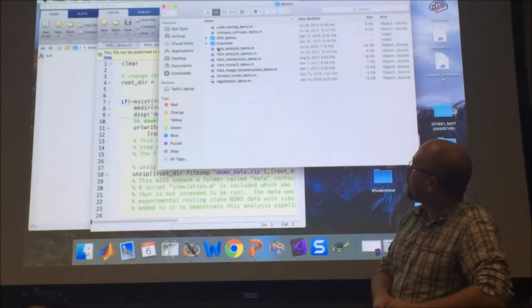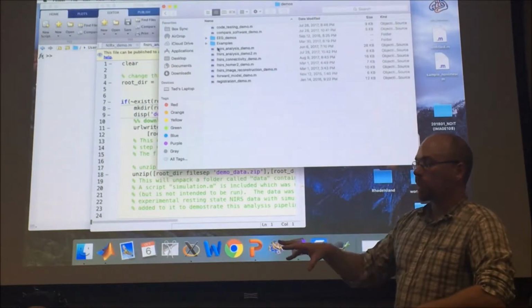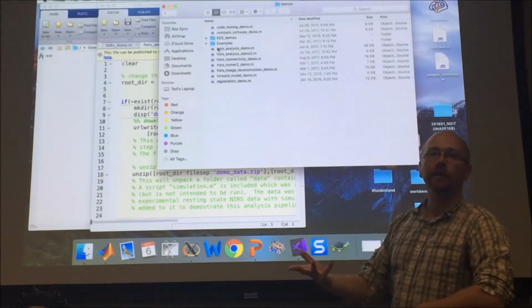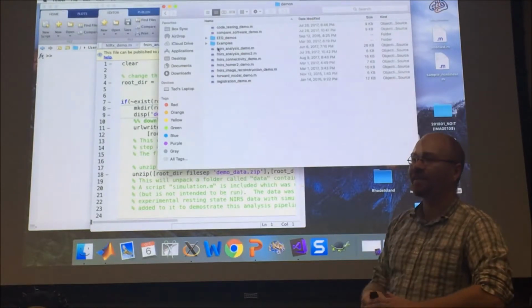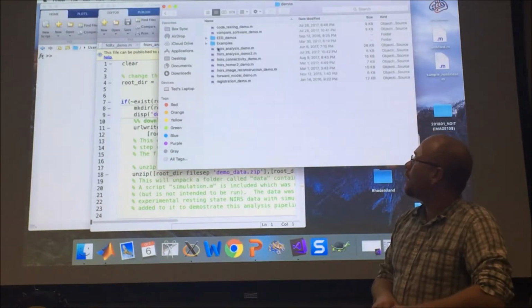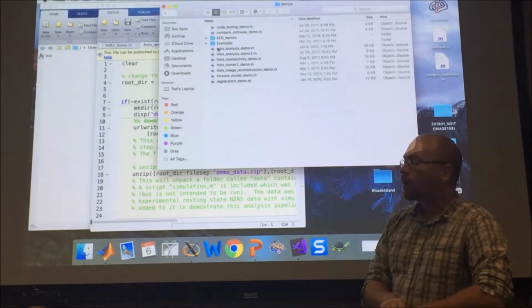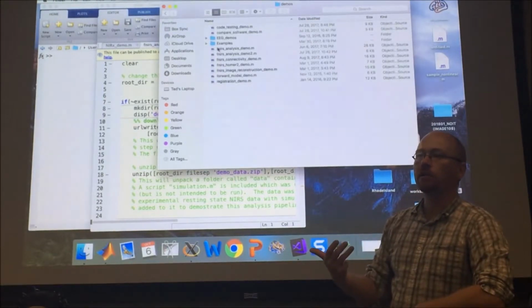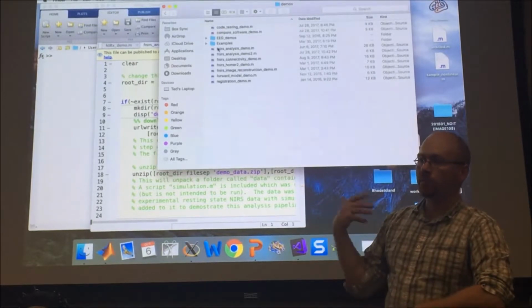Registration demo, that's how to do the probe registration. As I said, with the NIRx data, because you do it at the time that you set up your montages, it has all that 3D. So there's no need for this registration demo unless you don't have a NIRx system, because everything in that is already taken care of with the NIRx data. It's basically how you register your probe to a 3D atlas or something of that nature. It also goes through, and I'll show this when I pull up MATLAB, how you use that 3D information to say, I want to do a region of interest defined by the premotor cortex.